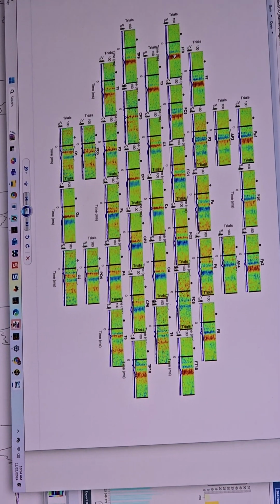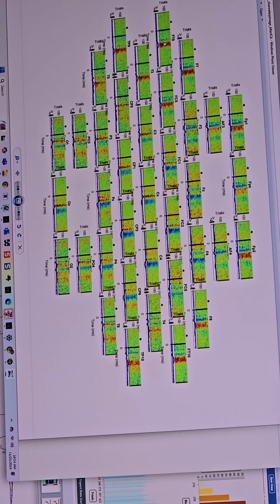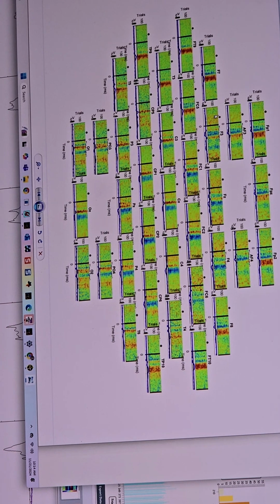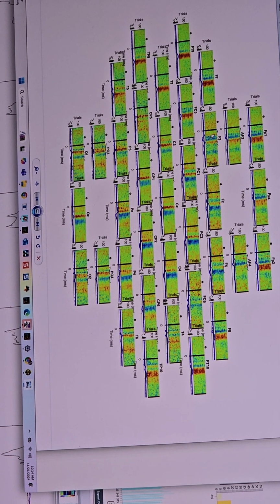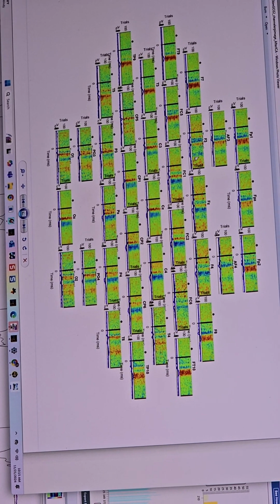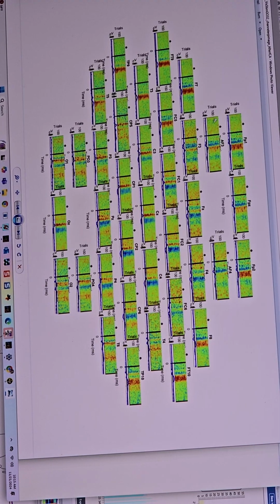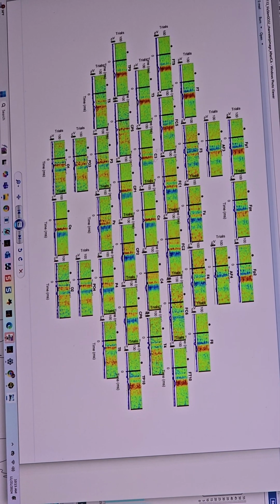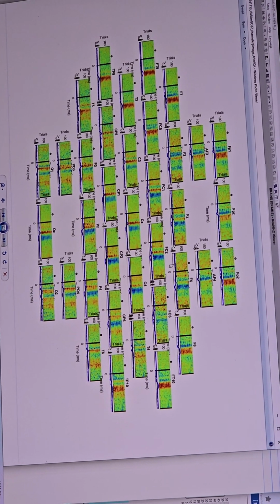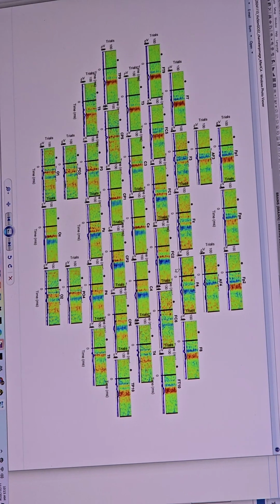For all 100 trials, your brain fired off at the same time. Very consistent, like 300. Except for the frontal lobe. See how sometimes it's early, sometimes it comes a little later? It's just all over the place. And so I suggested that your frontal lobe was dysregulated. And that tracks, right? We see that theta slowing, and so that's affecting your executive function and your attention.